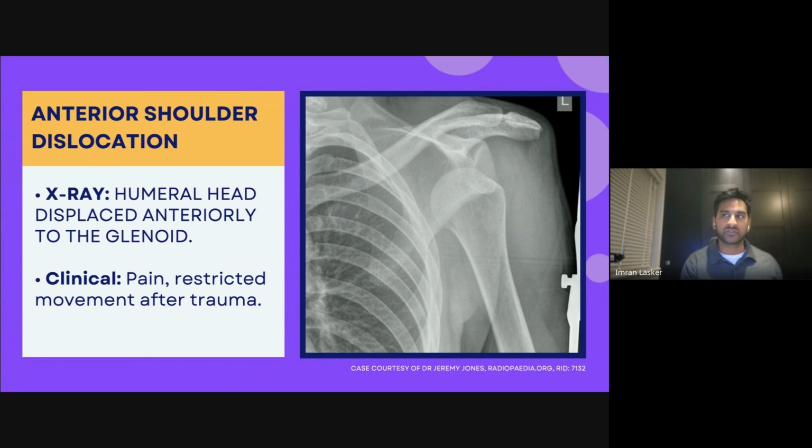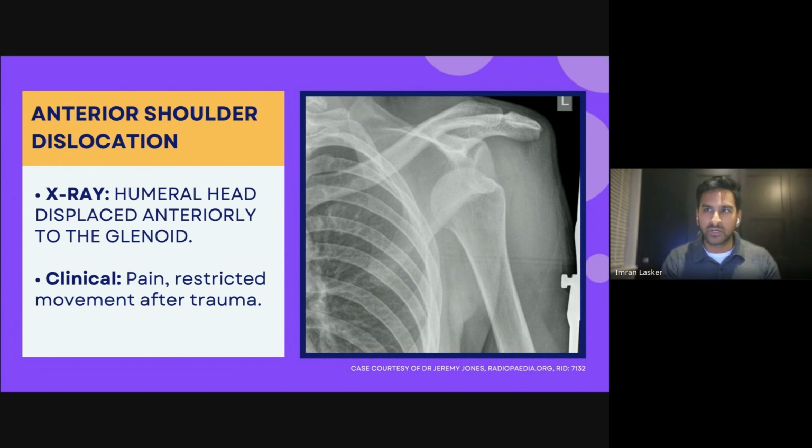They've gone and said they can't move the shoulder. You look at the contours and one looks a bit dipped compared to the other. Something doesn't look quite right. And so then you've got to try and look at the x-ray and try and figure out what's actually happening.